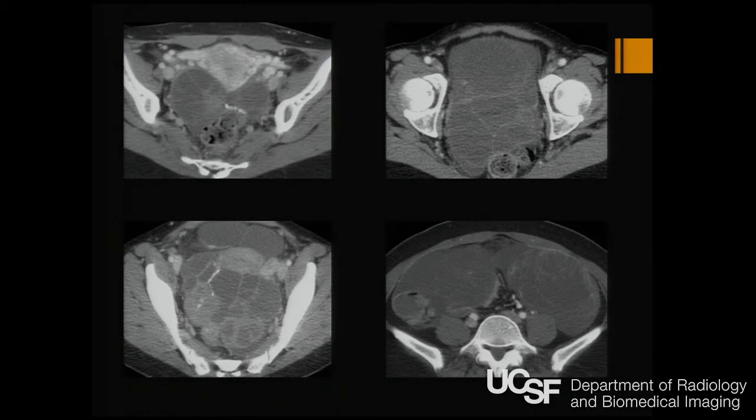So there's a final challenge I want to talk about, which is looking at these 4 lesions. And this is really to talk about primary ovarian cancer and metastatic disease to the ovaries. And there's one lesion here that's actually a primary ovarian cancer, and the rest are metastases. And I think the difficulty is actually figuring out which one is a metastasis and which one is primary.